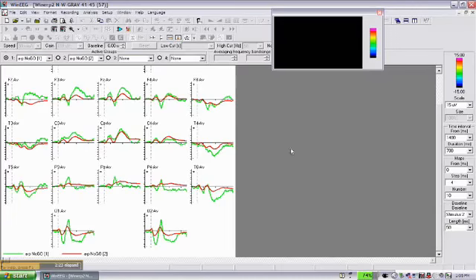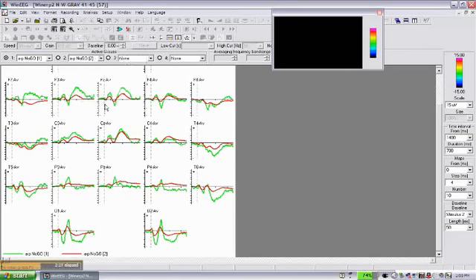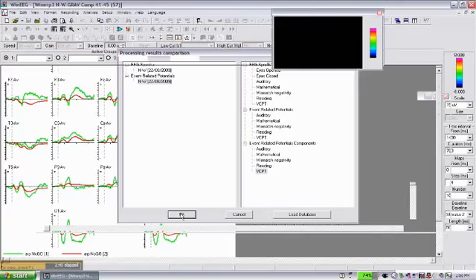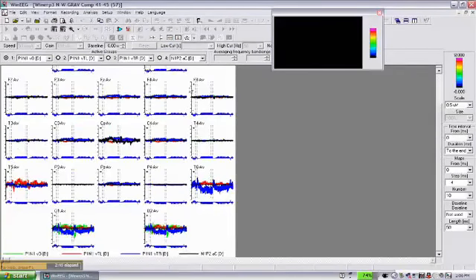It's better to decompose ERP into independent components. So let's decompose ERP into independent components and compare each independent component separately. We are doing this by clicking the event-related potentials component in the database. We are doing the visual CPT task. I click OK, and these are the results of comparison with the database.